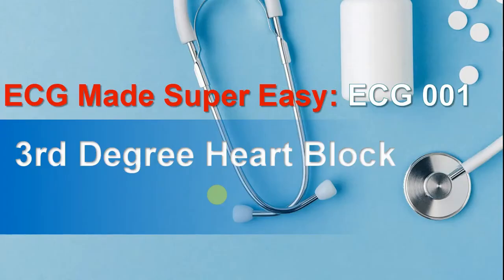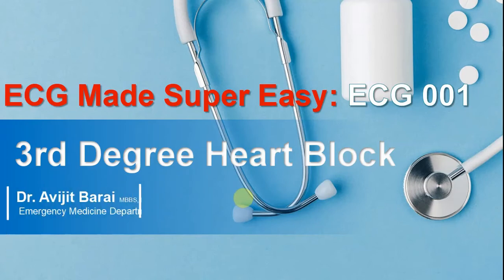Hello everyone, this is another video on ECG Made Super Easy. In this video we'll discuss an interesting ECG that we have found on Twitter, and this particular ECG is based on the third degree heart block.